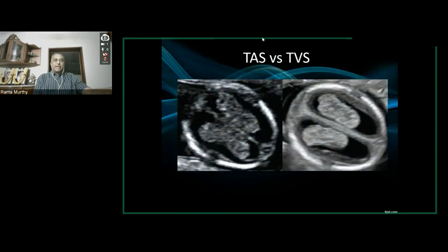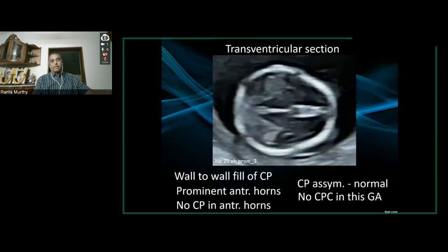Now, as early as this, we must recognize that transabdominal is what we do in day-to-day practice, but whenever there is a difficulty in visualization, a difficult patient, an obese patient, or presence of some anomaly or some anatomical region which you're not able to sort out with transabdominal, you have a wonderful window, that's the transvaginal window, which takes you so many notches above and makes your life a lot easier, right? So we need to liberally use transvaginal ultrasound wherever possible, and if there is an element of doubt or difficulty of scan in any situation.